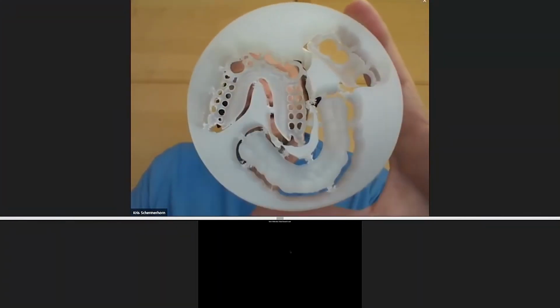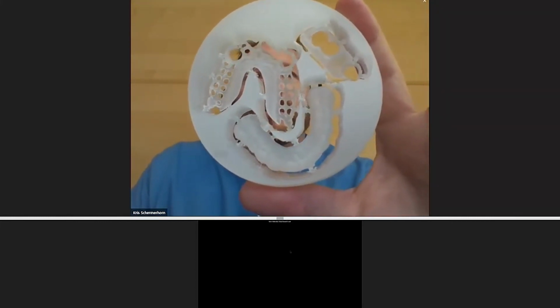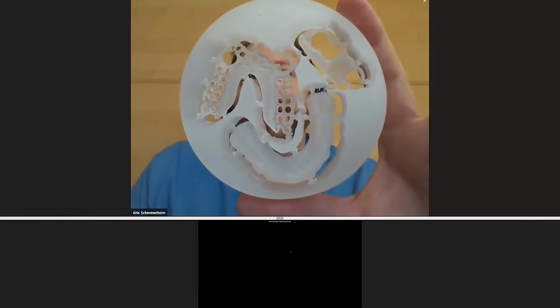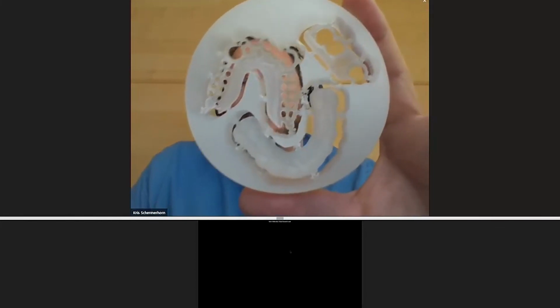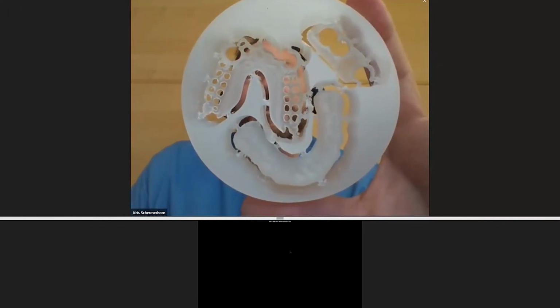One thing I want to bring up, this puck, it's nice and full. My mill's pretty quick. My mill will mill this out in probably about 4 to 4.5 hours. Other mills that are out there don't have quite the spindle speed. This is going to be in the mill for 6 or 7 hours. And not all of us can afford that. A lot of us have other crowns and stuff to do. And I actually rely on CMC to help out whenever I have milling that needs to be done, especially this time-consuming stuff.